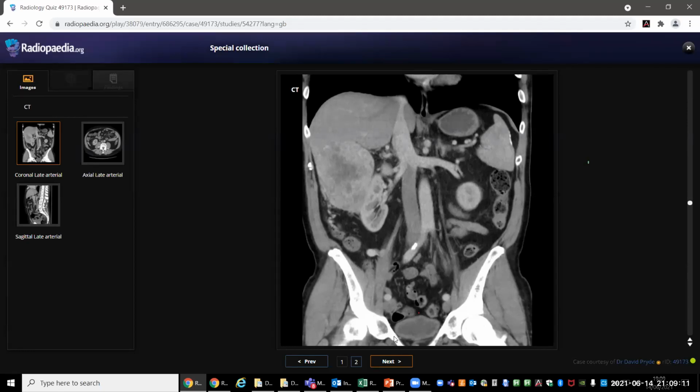So when you say unilateral varicocele, you have to start thinking of possible differentials like an abdominal mass, a retroperitoneal mass, or maybe a thrombus in the vein, something occluding the vessel. You have to go upwards and look for those causes to exclude. Thank you. I never knew this. I just learned it now. Thank you very much. You're welcome.